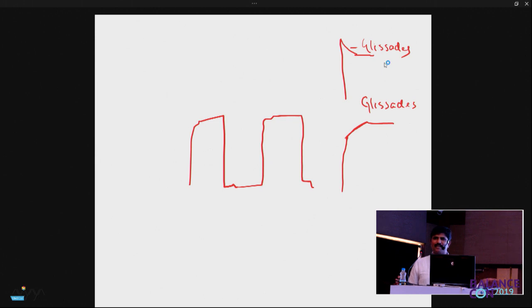Can you see that in the graph? Please look at the graph. The right eye movement has a problem only when moving to the right. The right eye moving to the left, there is no problem. Can you see that? It looks like the right abducting eye is weak for abduction. In this particular patient, we know the history, it was idiopathic intracranial hypertension.